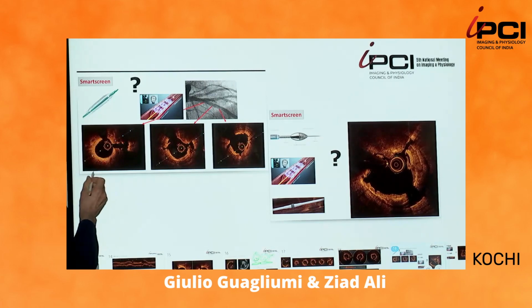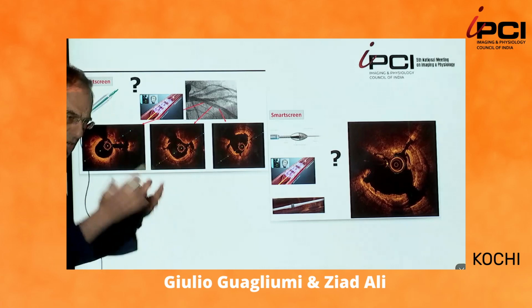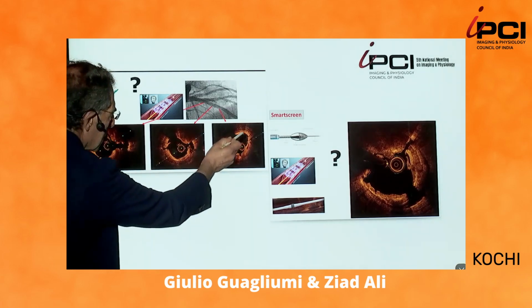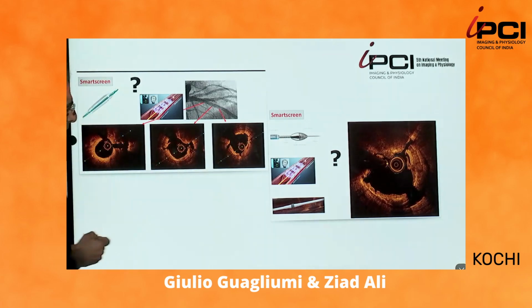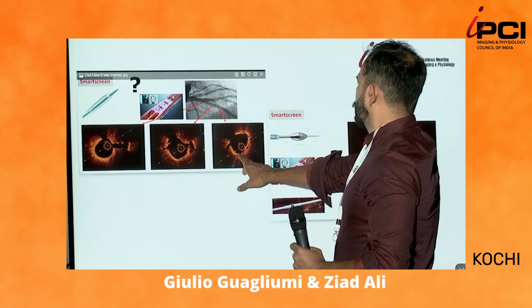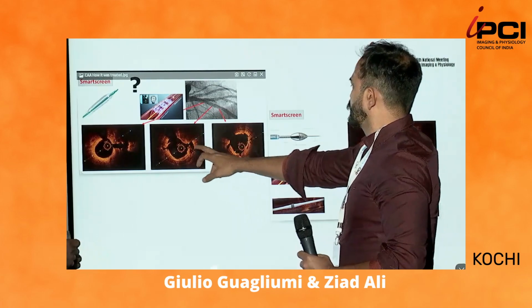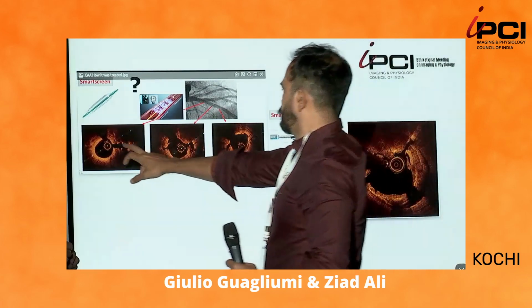This is the IVL, and what we have inside this picture is what? A crack? A dissection? An incision. Can we call this incision just to uniform the term? Incision, cracks, dissection. Probably these are due to a cutting balloon or something. It happens in a cutting balloon, we get such cuts. These cracks are IVL cracks.